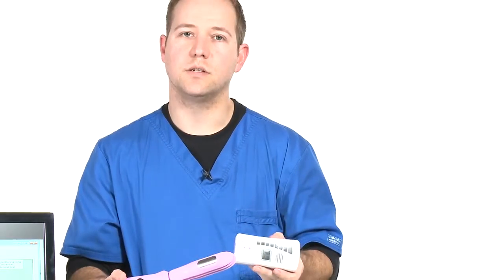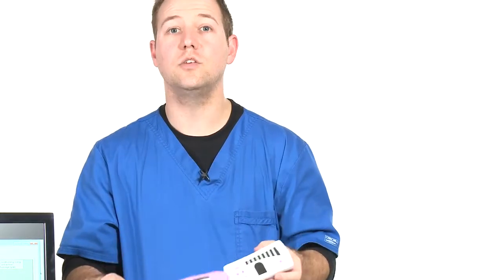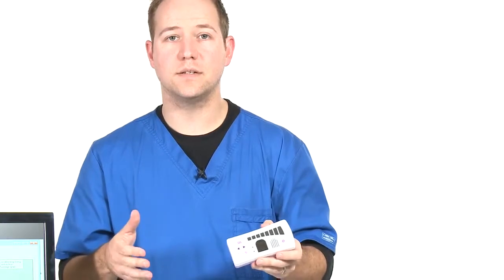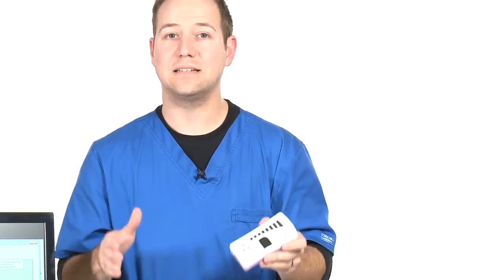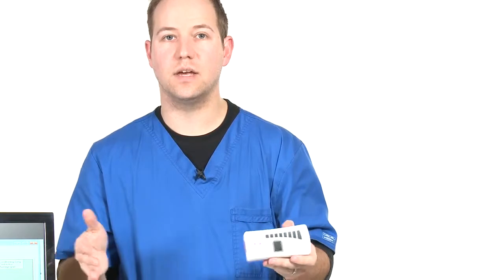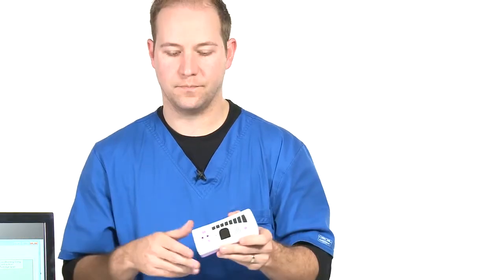When speaking with your patient, make sure that you set realistic expectations for the InTone. This is not a miracle cure. They're not going to use it one time and be dry. There is a protocol that they need to follow. InTone recommends that the patient use the device once a day for 12 minutes, at least 6 days a week. If they miss one day, that's okay. I typically have them use it every single day, so they get onto a regimented schedule where they're using it once a day, every single day for 12 minutes.